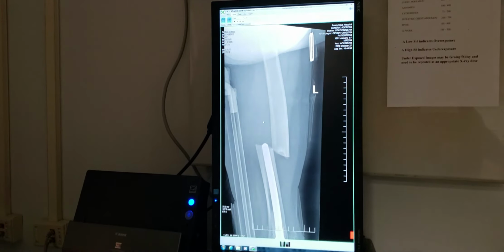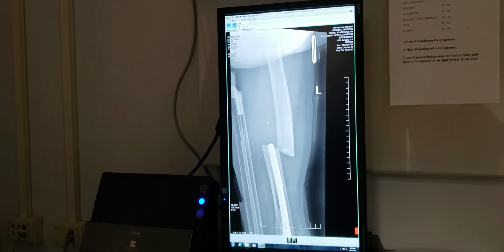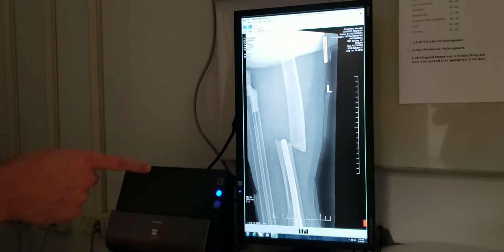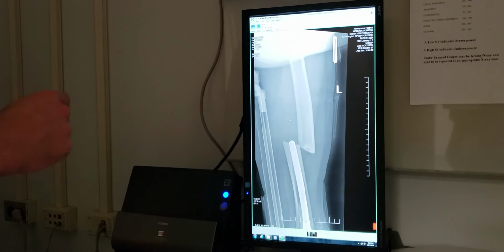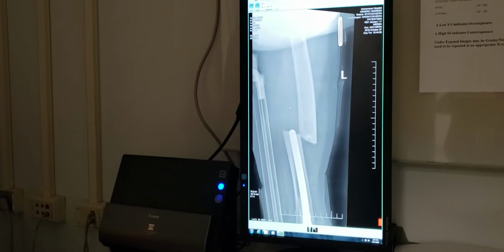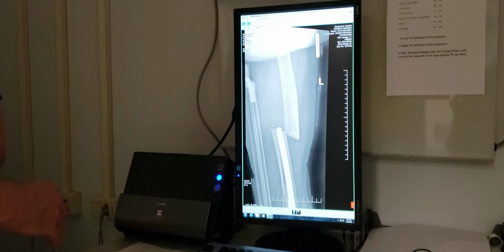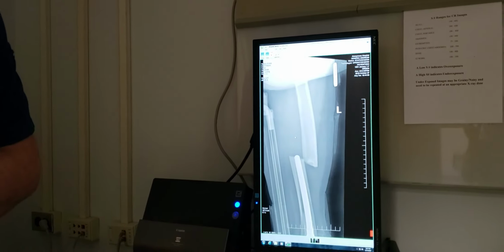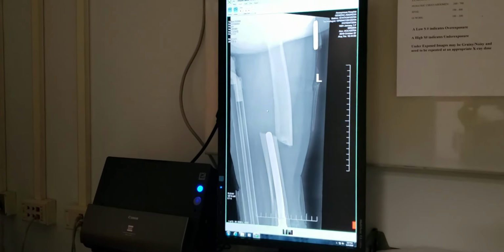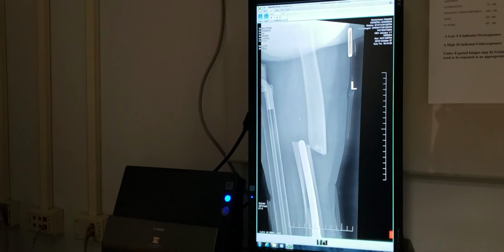As for a grade given for this, if there wasn't a lateral of the knee, I would give this a pretty poor grade because the joint isn't on there. But because of the whole knee x-ray coming in after this and included a pretty nice lateral, considering the circumstances, I would be okay with sending this through. I would say for this image maybe a C if it wasn't including the knee x-ray, and an A if it does.